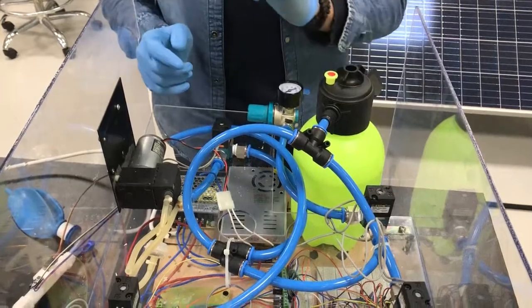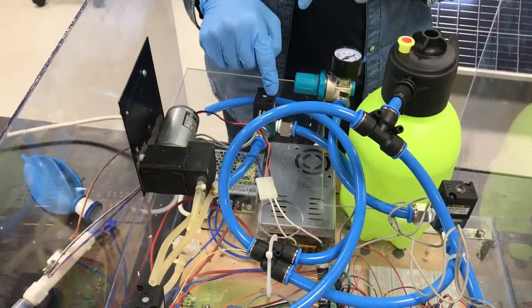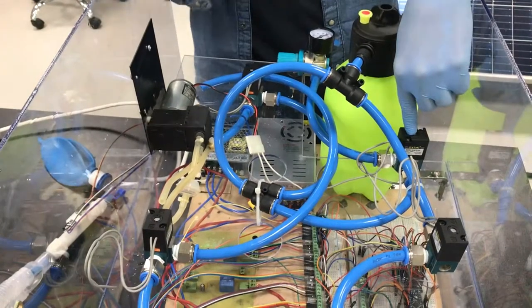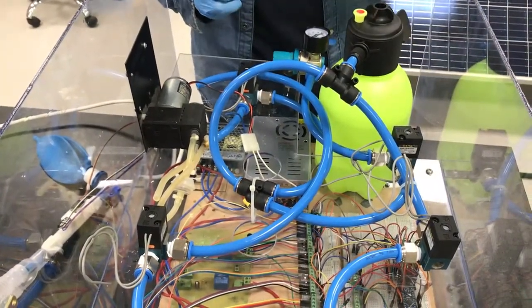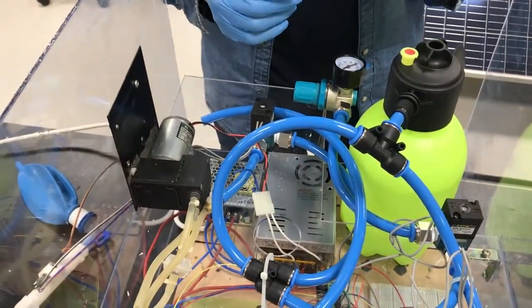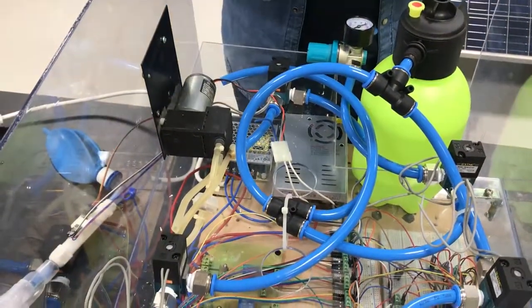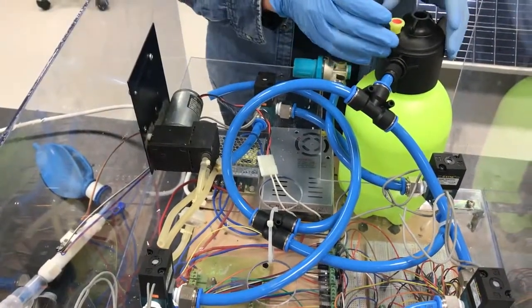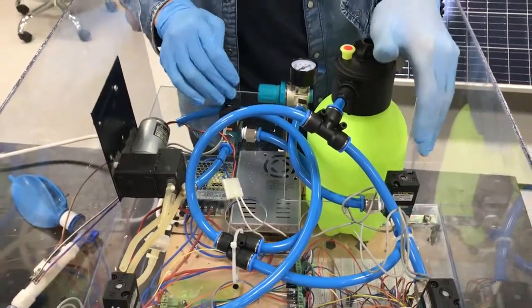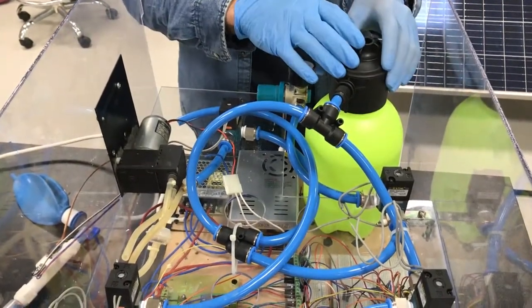But before this, you have a solenoid valve controlling the amount of airflow going in, and you have a solenoid valve to control exactly the amount of oxygen going into the tank. The pressure regulator here is basically to make the pressure coming from the oxygen cylinder exactly the same as the pressure coming from the pump. And after you have the mix, you control its concentration by the ratio of your valves. So these are high frequency valves to control the concentration and the pressure in the tank.